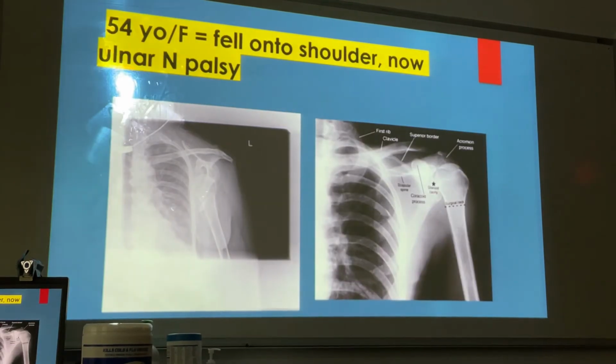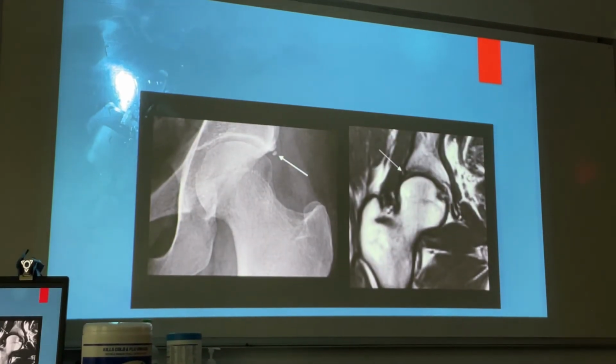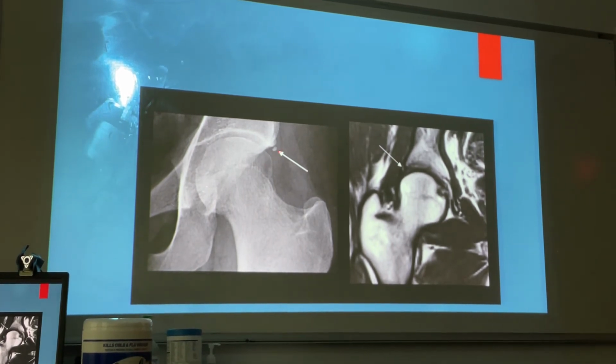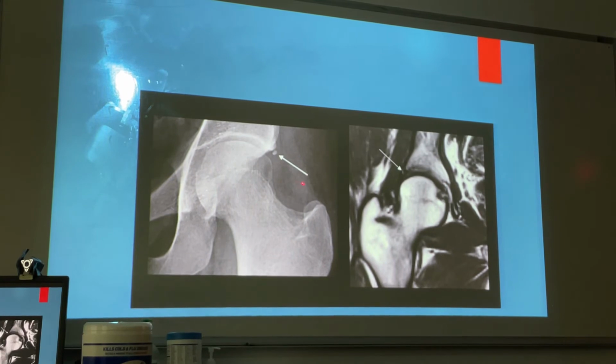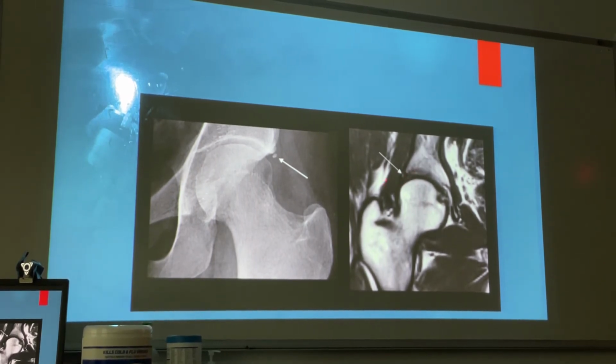Okay? I do have hip x-rays in here. All right, that was the point of it. So there's normal variance coming. Okay, this is a little ossicle, it's in the PowerPoint presentation, I just wanted you to see it. But the idea is if you get plain film and MRI, they're asking you to make a decision about the MRI. Is it the same size, is it worse, is it better?